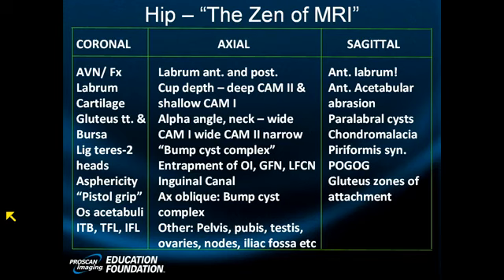Maybe, definitely, unquestionably, undeniably, still present, still there, maybe not. It's a big tear running from inside to outside. There are secondary erosions on the femoral head, down lower.